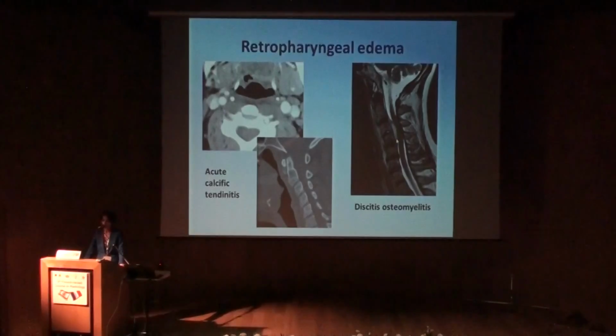And it can also happen, as shown here, in the case of discitis osteomyelitis, which is complicated by an epidural abscess, but also has retropharyngeal edema.